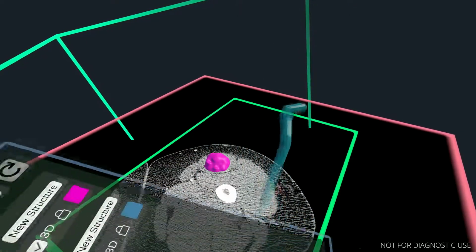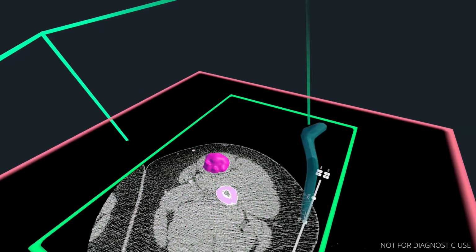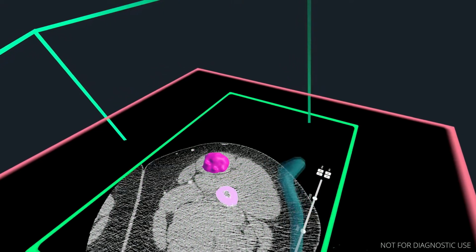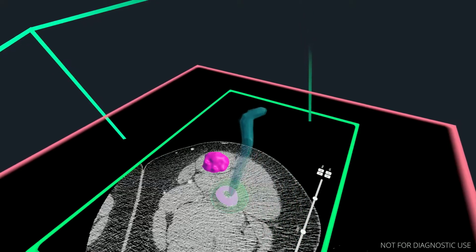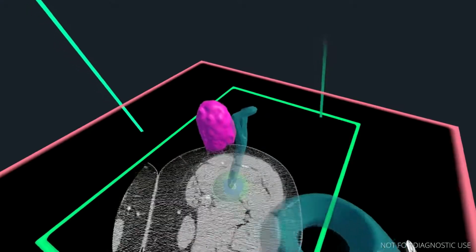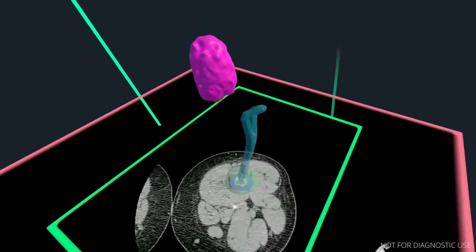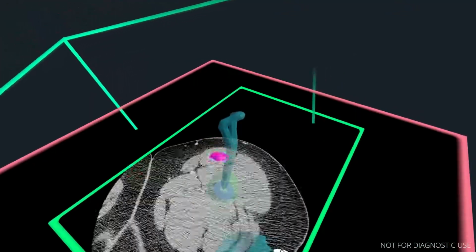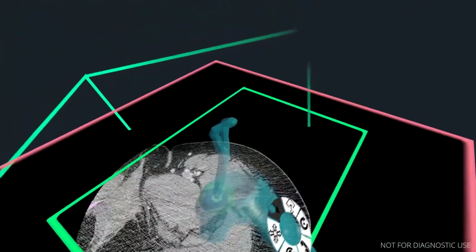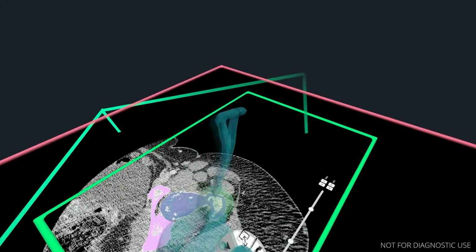So this one will be very easy because the bone will be very clearly distinct from the rest of the image. In fact, I'll even turn off reduce noise because I don't think that we'll need it. Okay. So I'm holding the pen down on the surface as I'm moving the image in and out with the controller. And then I guess we'll go right up to the pelvis here.